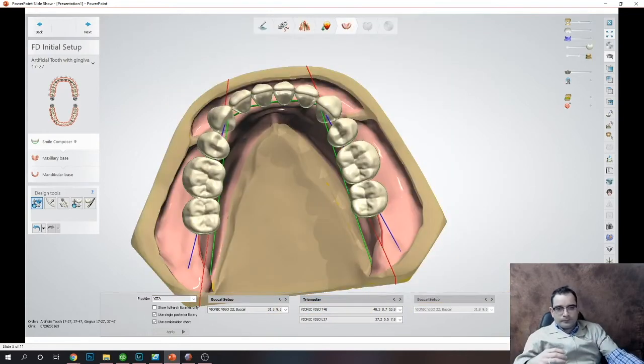Okay. And here you can see those same lines on this model. You see the green line for inner correction, the blue for outer correction, and red for ideal. And within those confines, you can take your teeth and move in one way or the other, especially when you're dealing with, let's say, a class 2 or class 3 situation. The software, especially 3Shape at this point, presents everything in class 1 ideal, and you're going to have to go from there and just adjust those things.